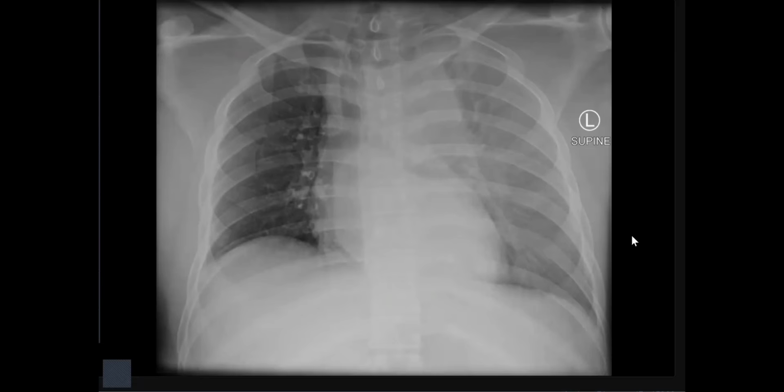Along with that, there might be a pleural effusion causing a homogeneous increased opacity in the left hemithorax. So I would recommend CT thorax to rule out any aortic or major vessel injuries and correlate clinically. If this is a short reporting style, you did it very well, my friend.